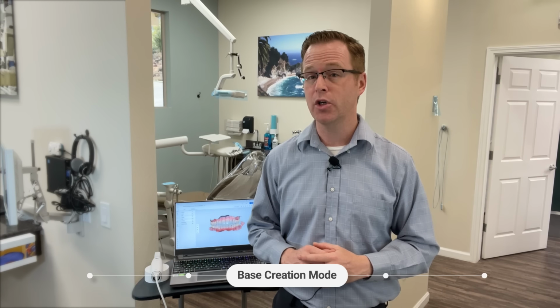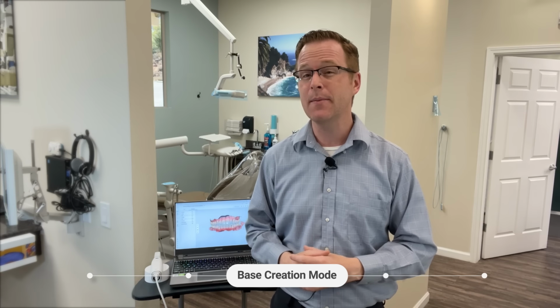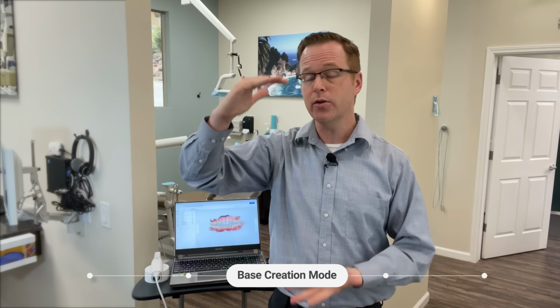By clicking Next, it will automatically start to give us a preview of what the positioning and the occlusal plane of the model are desired for my particular case. We can then choose the model height function by dynamically sliding the sliders up and down, making short work of choosing how big and how tall my models are going to be. By doing so, it allows us to print big models or little models.